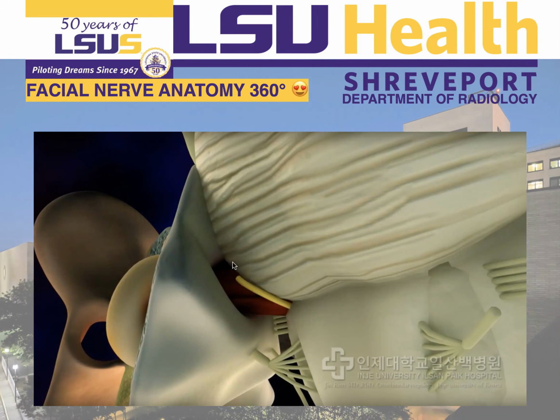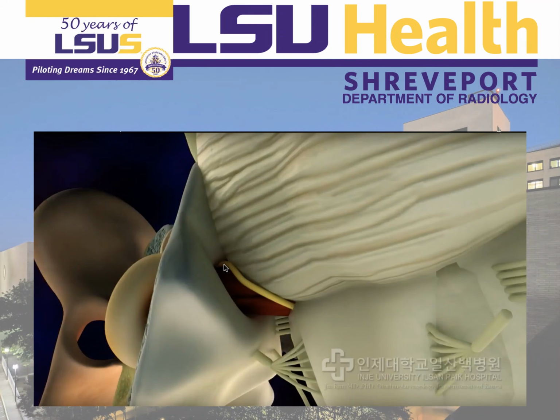Okay, so let's jump to the facial nerve anatomy. Here's a 360 3D image. It's very good. You'll see the facial nerve arising from the brainstem, going to the internal auditory canal.